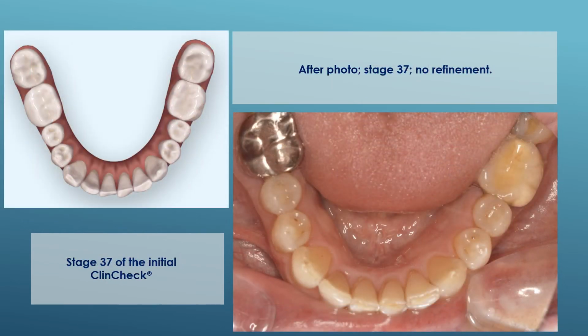And this slide shows the result for the lower arch. The upper left is the proposed outcome, stage 37 of the initial ClinCheck, and the photo is the after photo. And again, you can see how closely they compare. So Invisalign can definitely reshape dental arches.